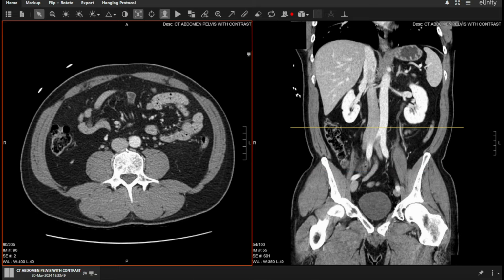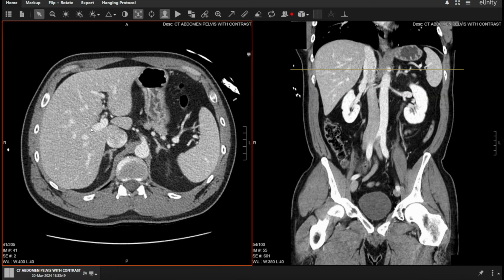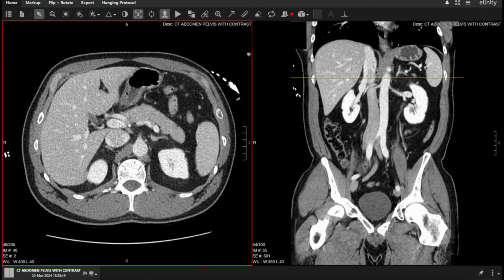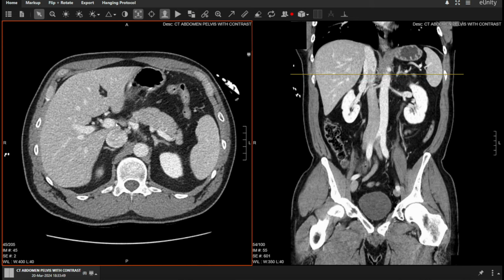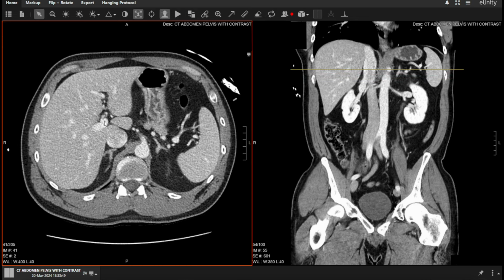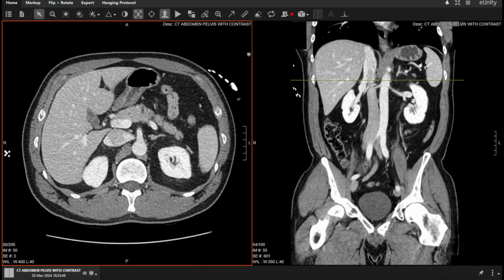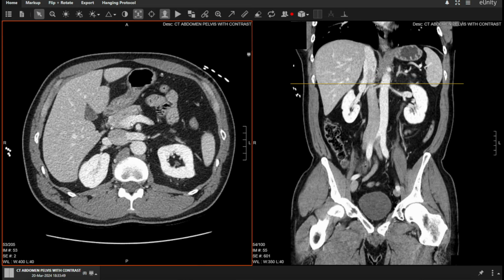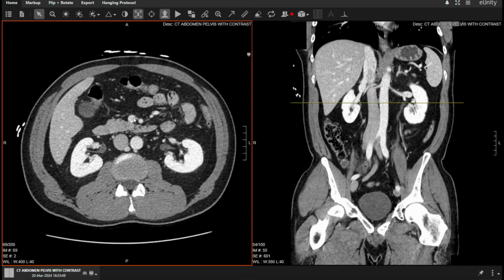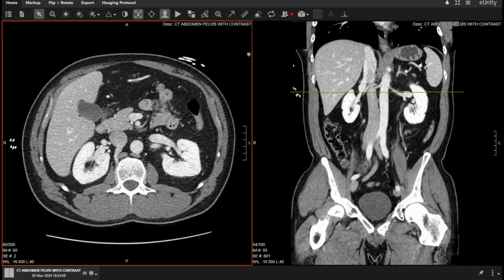Now finally, let's look at the portal venous structures. Here we have a separate large vein, the portal vein right here, draining into the liver. And you can see the portal vein splits into its branches here. The portal vein is made up of a confluence between the splenic vein right here. This is splenic vein. And the superior mesenteric vein right here. So you'll see this is draining the mesentery, intestines, comes together here.